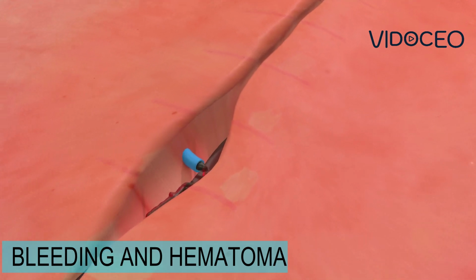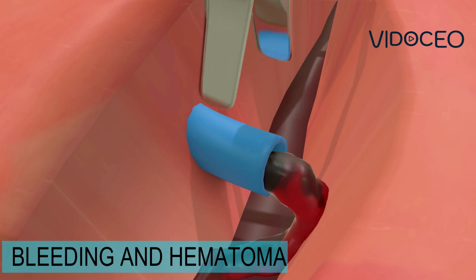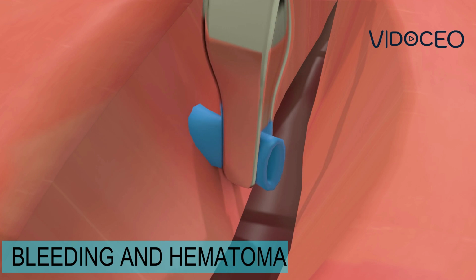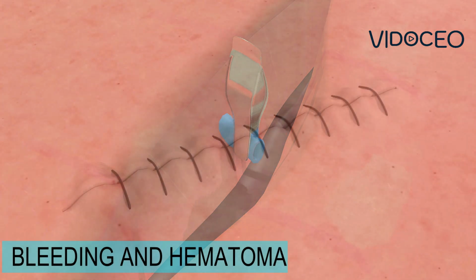Minor bleeding from vessels in the abdominal wall, or skin, can occur during, or after, surgery. This bleeding can be stopped with specialized tools such as clips, stitches, electrical cautery, or vessel sealing devices. Minor bleeding very rarely leads to the need for blood transfusion.